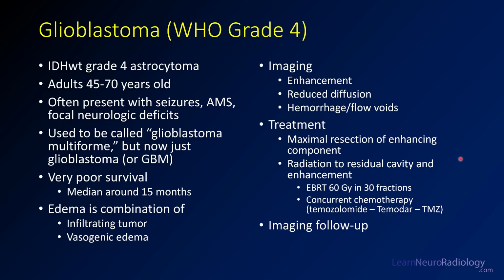This is a typical imaging appearance of a glioblastoma, one of the couple of things which crosses the corpus callosum, including lymphoma, occasionally demyelinating disease, but glioblastoma and lymphoma are the kind of things crossing the corpus callosum that you should be thinking about. So thanks for tuning into this video, seeing this glioblastoma case.